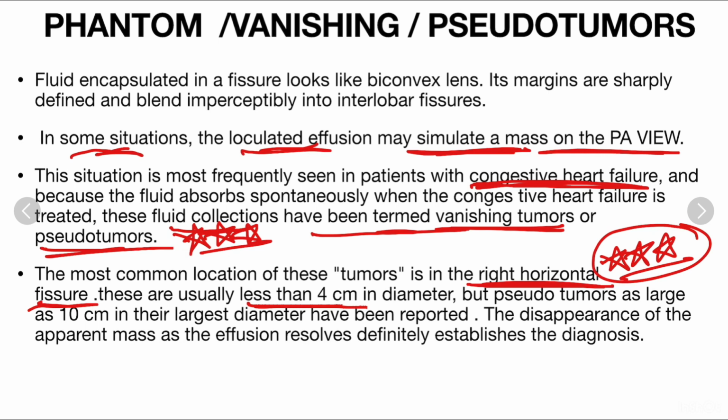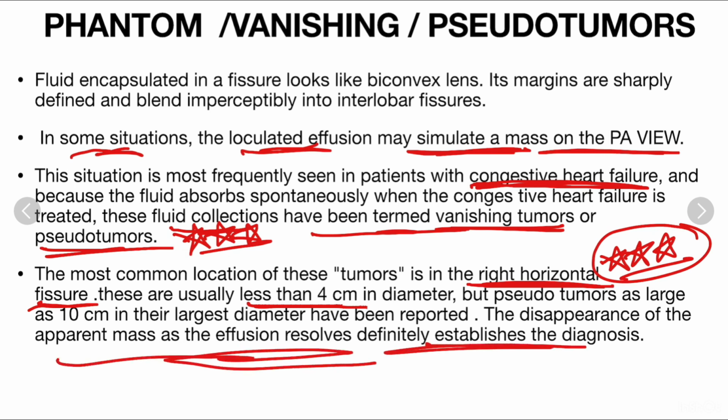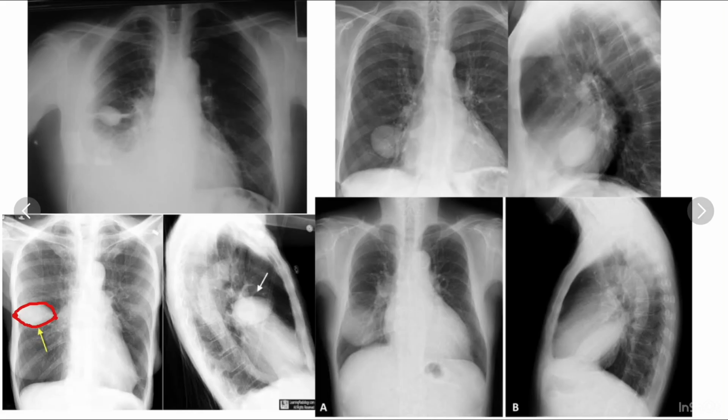The disappearance of the apparent mass as the effusion resolves definitively establishes the diagnosis of phantom tumor or vanishing tumor.